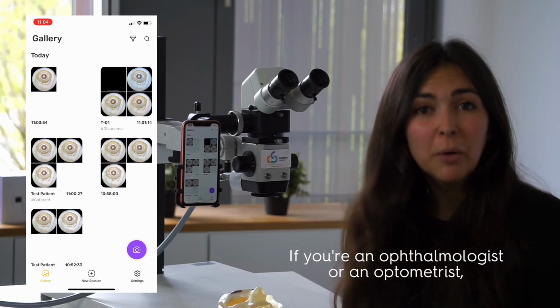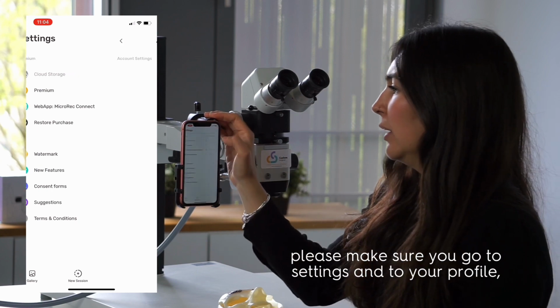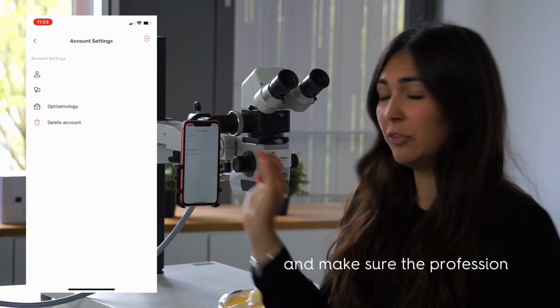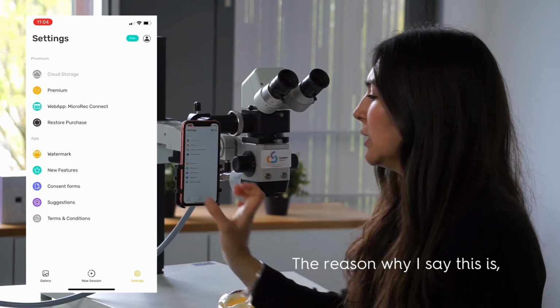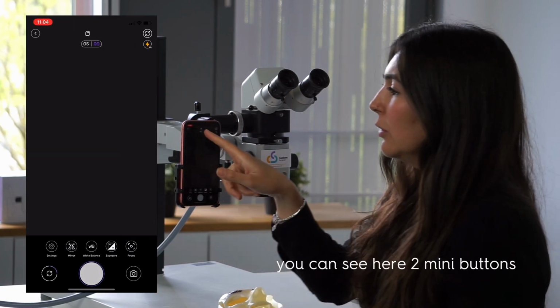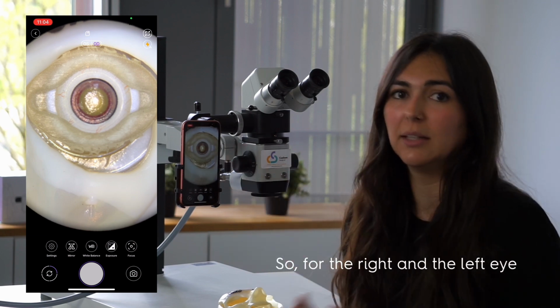So if you're an ophthalmologist or an optometrist, please make sure you go to settings and to your profile and make sure the profession that you have there is ophthalmology or optometrist. The reason why I say this is basically when you go back to the camera, you can see here two new buttons that say OS/OD, so for the right and the left eye.